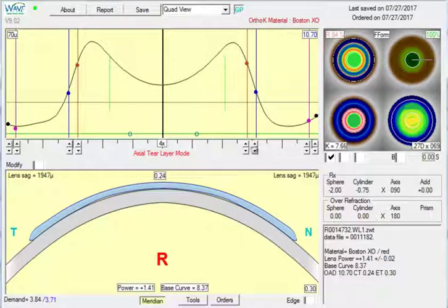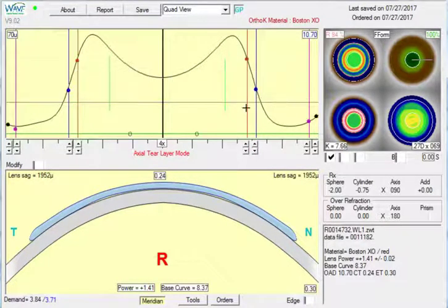A little bit more, and we're at 662. So you are correct, the new graph looks very odd. Looks like this lens ought to not work at all, but based on the data we're seeing on previous lens designs, this is probably the way we need to go.